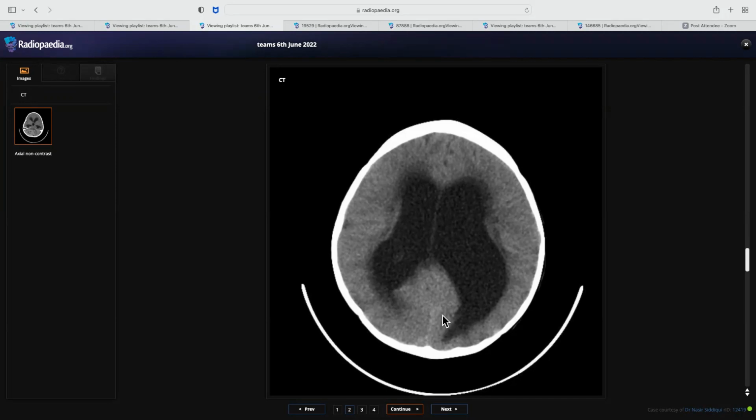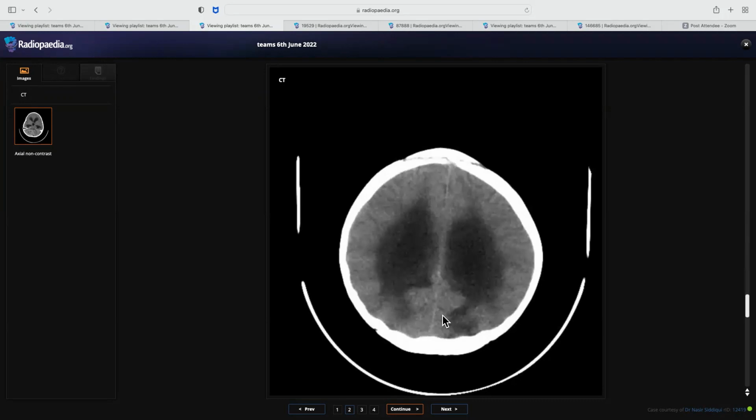Then I would advise an MRI brain to characterize the lesion better. Will you advise anything else also? For hydrocephalus, I would alert the neurosurgeon to decompress at this zone. Anything else after informing about hydrocephalus and shunting and MRI brain? I would also screen the neurospine for any drop metastasis, because both ependymoma and medulloblastoma are known for drop metastasis.